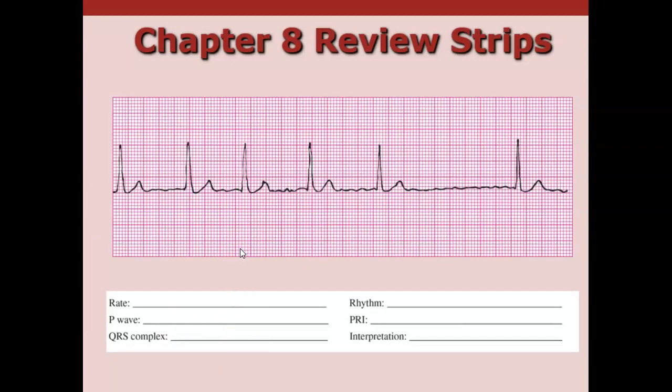Now, the curriculum does not say this, but I always like to talk about 3 quick, hard, fast rules for atrial fib. One is irregularly irregular. So we see there's not a pattern of this irregularity, that it's just irregularly irregular. 2 is you have no discernible P waves. We have no P waves, what appear to be P waves. And then 3rd rule is you have fibrillatory waves. So these little bitty fibrillatory waves that you see throughout here. Those are my 3 rules for atrial fib.